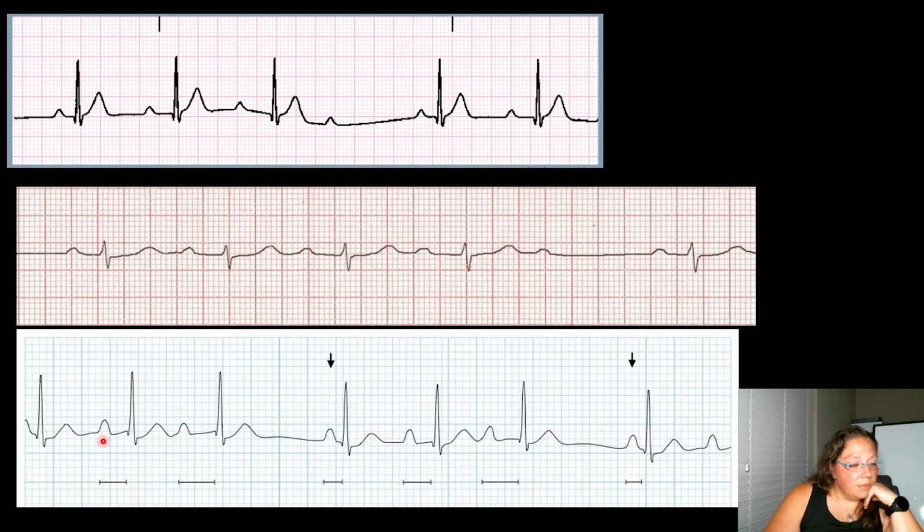And last one, you can see here, nice and close, longer, and then a drop. Here's nice, close together. This one is longer, and then there's a drop. And here you can see they measured out the PR intervals for you, so you can see how it gets longer.